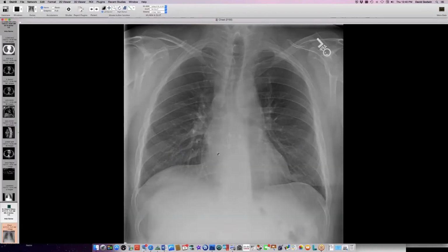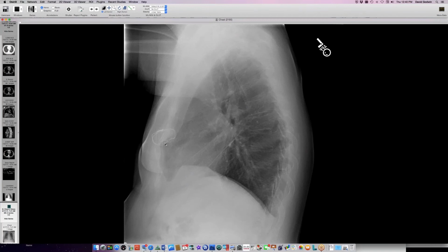Yeah, this is 2016. At this point, you can see that I think the wire is broken already. You know, these are very precarious fixations here of the sternum. With a normal median sternotomy, you've got a big surface area that you're opposing. You've got several wires doing it. With these transverse ones, you're basically trying to perch this little piece of bone on top of another little piece of bone, and there's a lot of movement of the sternum, and you just don't have a very secure fixation.